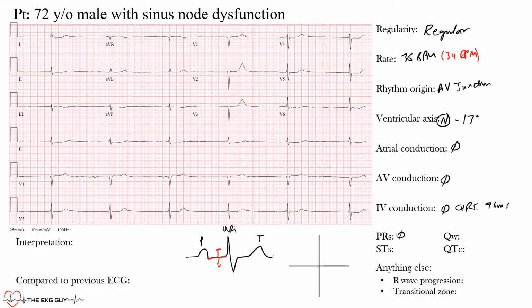Next, we want to look at the QRS complex, which is this one here, and we're looking for any abnormal or pathologic or significant Q waves that may represent a prior infarct, and sometimes an ongoing one, or acute injury. So what we see here actually are a Q wave in V1, in V2, and maybe V3. You may see this initial portion that may be a small R wave, but certainly in V1 for sure, we see that. So V1 is one that we should keep on.